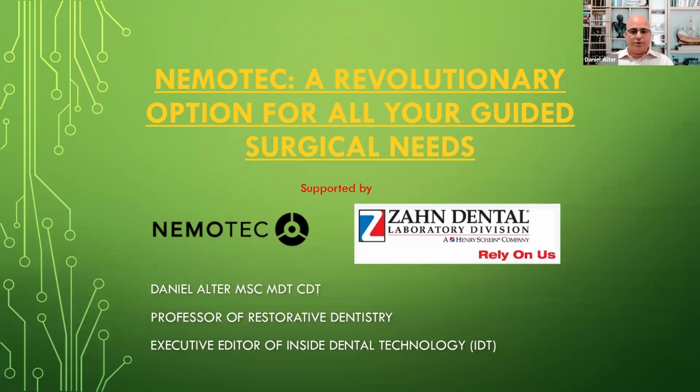And I'll demonstrate, you can even create a custom abutment as well as the prosthetic and the restorative thereafter. So in one software package, you can really get to the point of not only planning and creating a surgical guide, but also having ultimately the end result in mind.